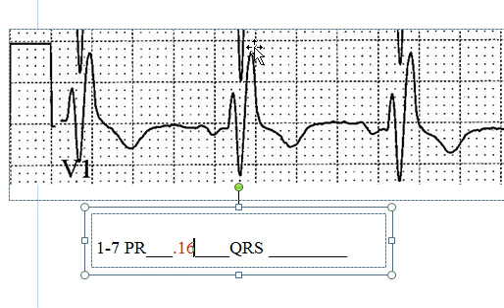Again, we'll be talking about these weird QRS configurations. But again, this is all QRS because we haven't done any straight lines yet. So you leave here, start your QRS measurement here, and you will go until the point where you see him going sideways again, because sideways can never be part of the QRS. So you have to decide where this R wave comes back down to the baseline and where he's going more sideways than he is going up and down.